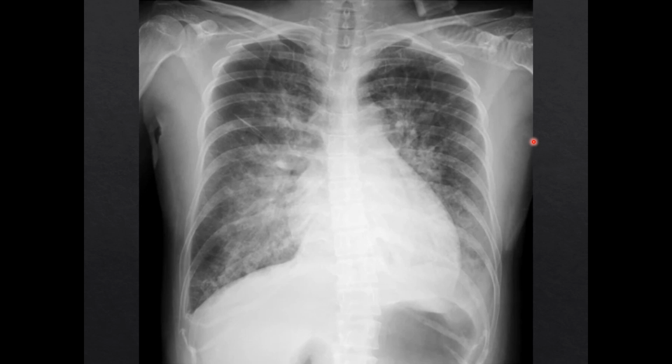Cardiogenic pulmonary edema can also show a subtle finding called Kerley B lines, which can be seen at the periphery of this image. These are interlobular septa thickened by pulmonary edema in the lymphatic channels of the lung. Peribronchial cuffing can also be noted as fluid builds up in the interstitium.